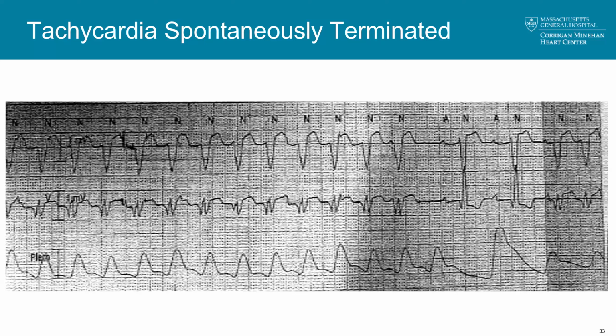And so here, based on this difference between what are clearly sinus beats and what are the tachycardia, this actually helps us make the decision that this is ventricular tachycardia.